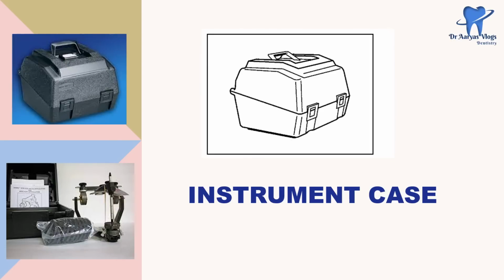And finally, this is an instrument case. This is an attractive and durable case which has been constructed to contain the articulator and the facebow. It provides protective storage and transfer to or from the laboratory, specifically for Wide-Vue articulators.